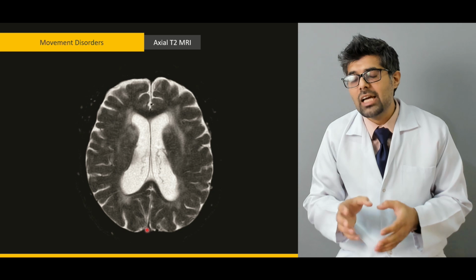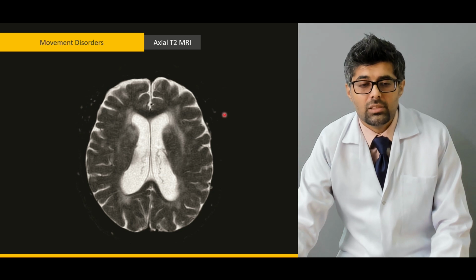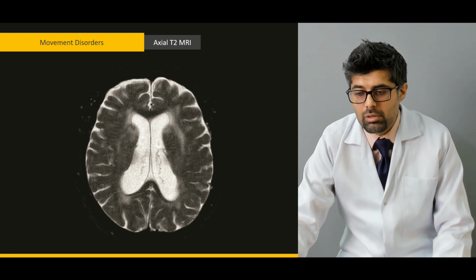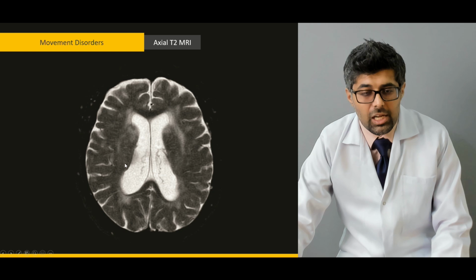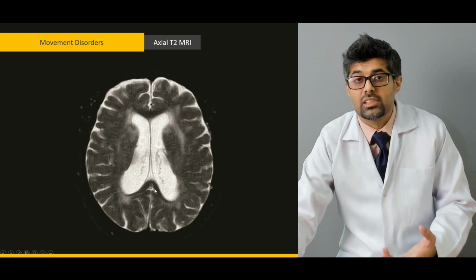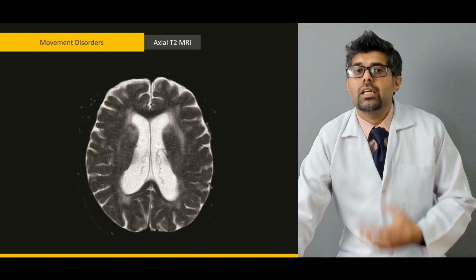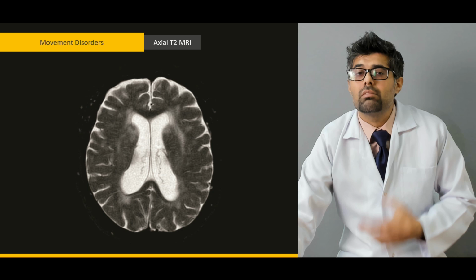Now, this NPH condition can only be diagnosed on an MRI. This is a cross section of an axial T2 weighted MRI, and you can easily appreciate here that the lateral ventricles here are extremely dilated, and they are dilated because of the hydrocephalus, because of the excess amount of the CSF that is being circulated. So for NPH, MRI is the only diagnostic and confirmatory modality that is being used.